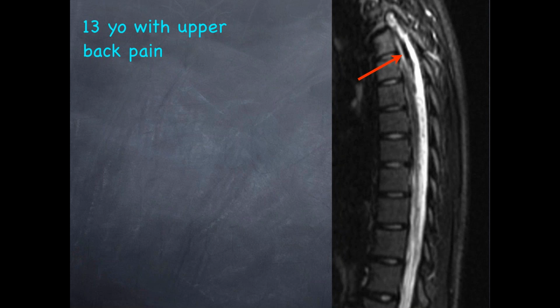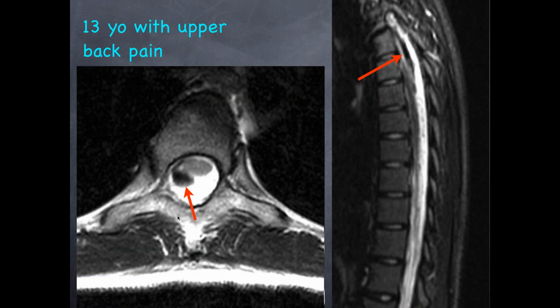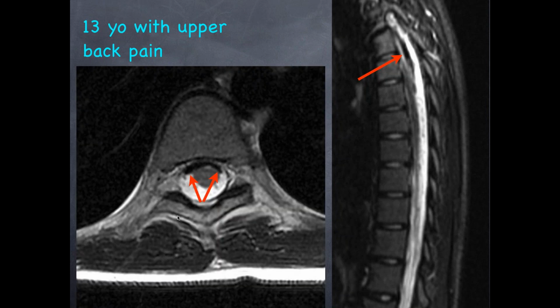Okay, here's an axial image right through that area. Well, I don't actually see cord there. It looks like the cord was way anterior. Right here. Yeah, so this is a T1. This is an axial T2 and a sagittal stir. So, that's one cut. Here's another cut. Okay. Here's another cut. I wonder if this is just flow voids of some sort. Yeah. So these are flow voids.